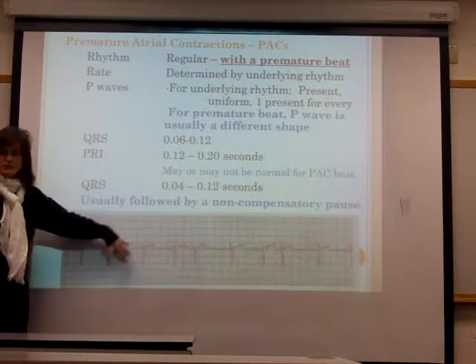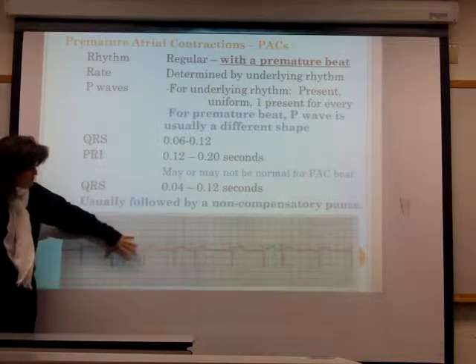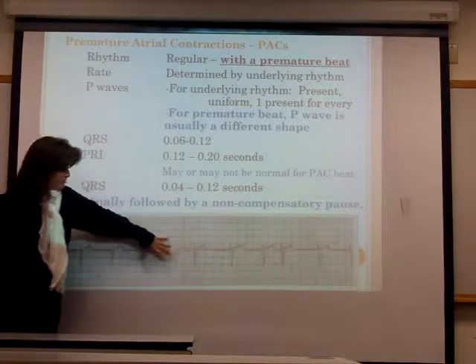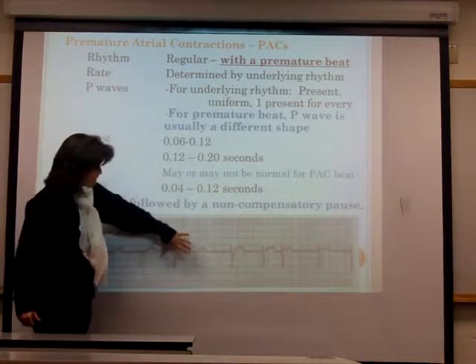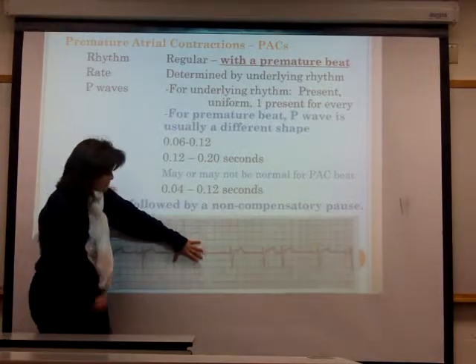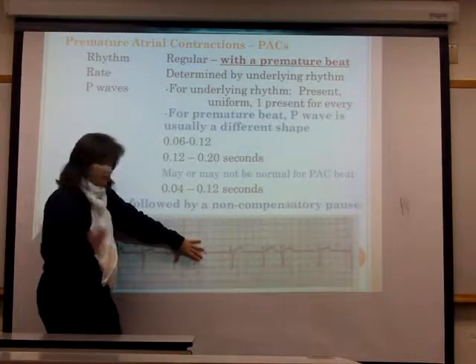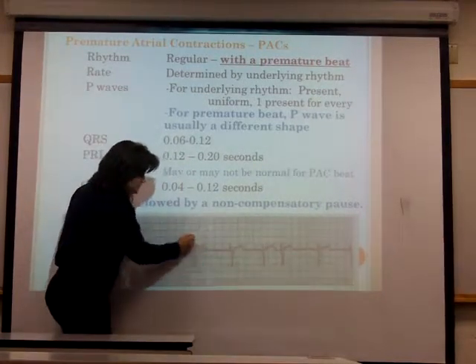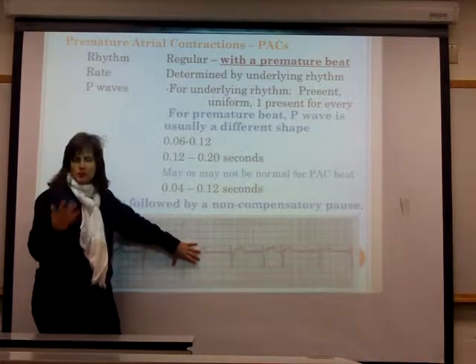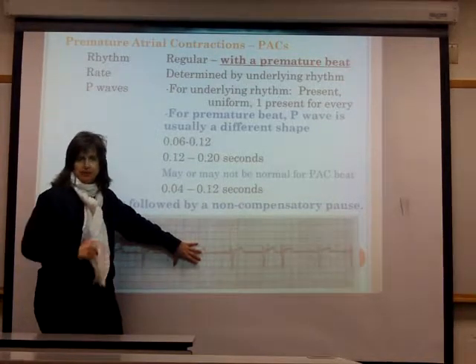So again, we're going to look at regularity first. If I put my calipers here, I go from here to here and here to here. So far, very regular. I go from here to here. That's my first sign that there's something wrong. But I noticed that that beat came significantly early. So I'm going to take my pencil and very lightly circle it, trying not to disturb any of the complexes. But I want to make sure that I don't forget to address this.